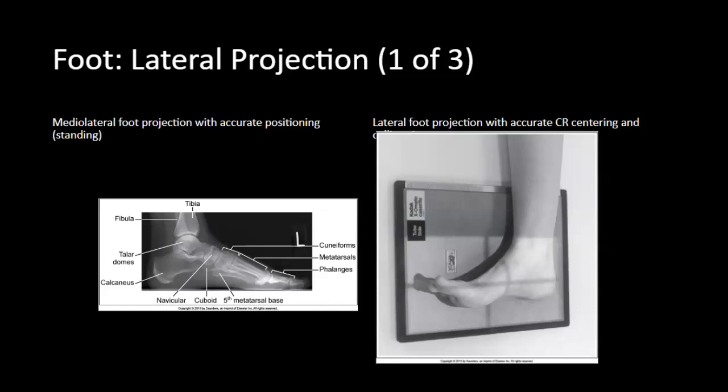The distal fibula is demonstrated about a 1/4 inch distal to the distal aspect of the medial tibia. The talar domes are aligned anteriorly and posteriorly. In a patient with an average medial arch, 1/2 of the cuboid is visualized posteriorly to the navicular bone. And the anterior aspect of the distal fibula is aligned with the mid-tibia. The posterior half of the distal tibia superimposes the fibula.